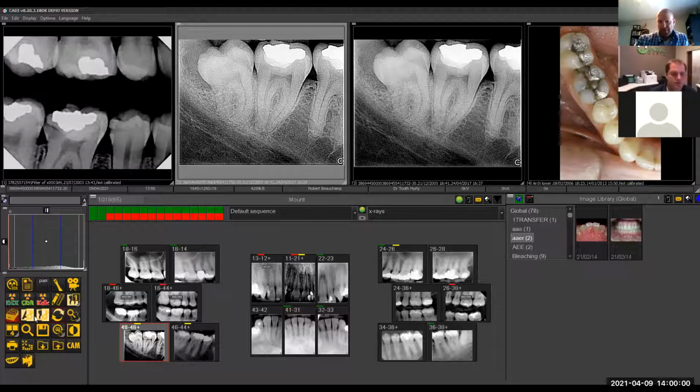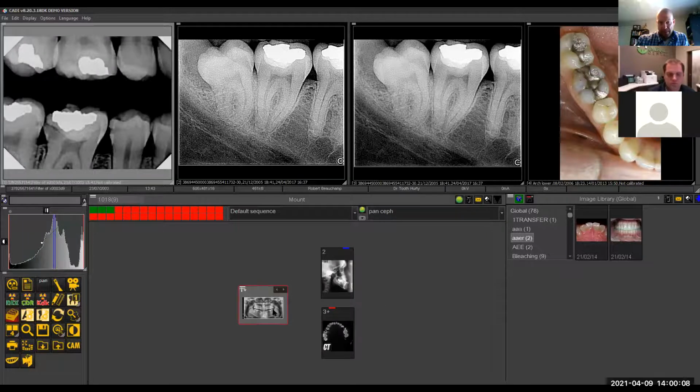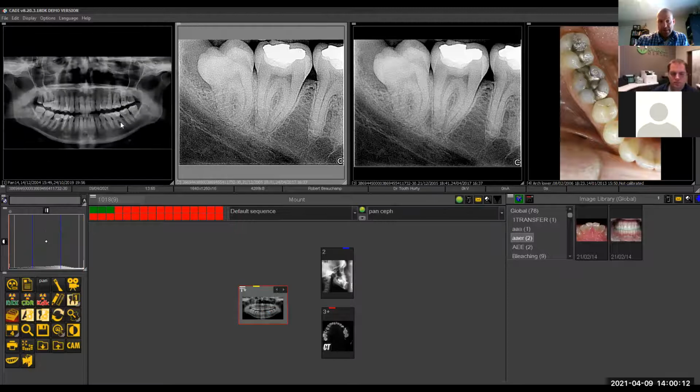Well, there's a couple other little features I could mention and show you. It's minor stuff. Let's say for a pan, if you did have a pan up there, you can always segment out and crop out stuff of the pan. Awesome. This is the ROI tool. There's two tools: you either take out a square or you can freehand it. I usually use the square.